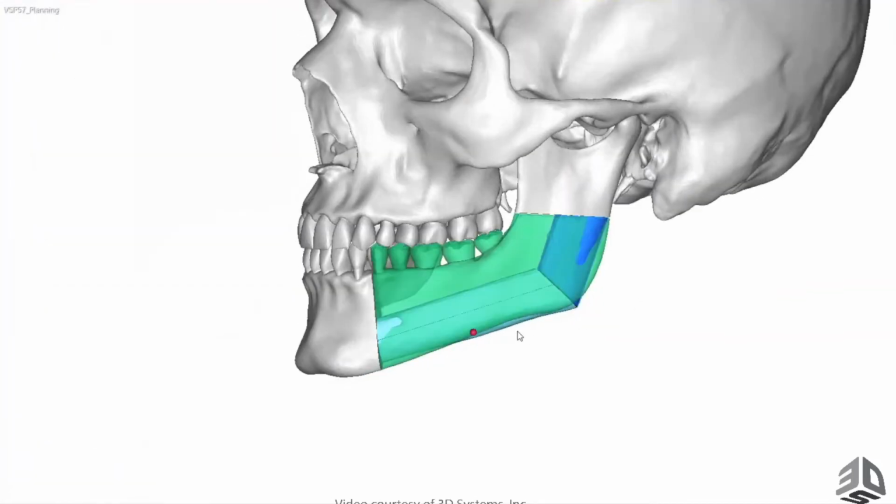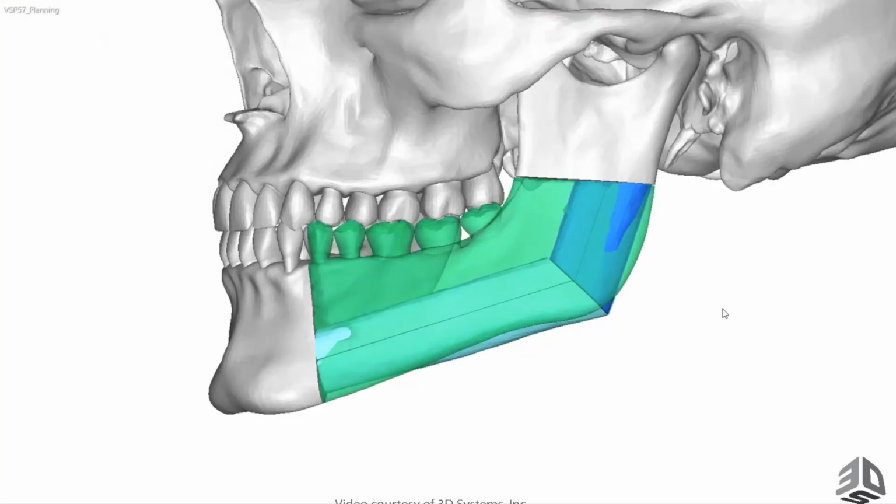And then here's that compared to the resected anatomy in the green there. Okay, perfect. So just another couple of points that I'd make. If you're likely to need a large segment of fibula, 2-part, 3-part, that means that your pedicle is shortened. If your pedicle is shortened and coming out the front, it's going to be a long way to reach the facial artery. So invariably, you will need to bring the pedicle out the back, particularly when you need long segments.